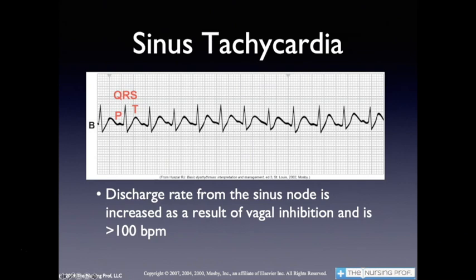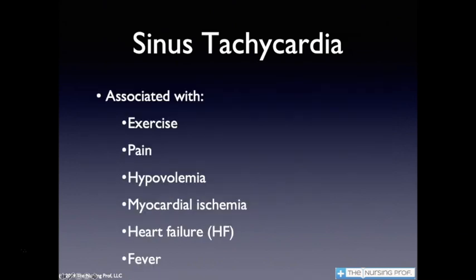Sinus tachycardias typically are going to be caused by some underlying condition like a fever or exercise or something like that. So it's usually not associated with anything that's really harmful, although it could be a myocardial ischemia that's causing some sinus tachycardia. But this is not the kind of rhythm that we're going to run out and try and treat. We're not going to give medications and try and slow it down or anything like that. What we're going to do is try and treat the underlying problem. So if the patient has just exercised, have them sit down and rest for a few minutes. If it's pain, let's treat the pain. Hypovolemia, treat the volume, etc.